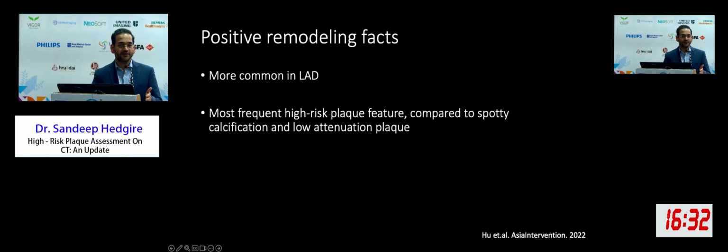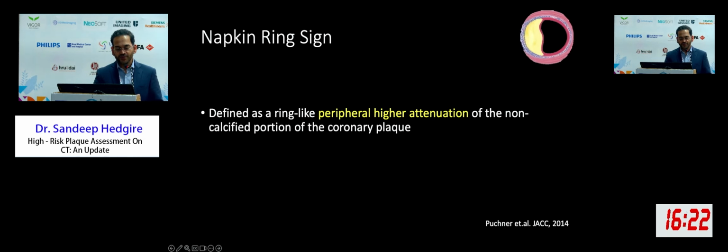So high-risk plaque feature like positive remodeling is much more common in LAD, and it is the most frequent high-risk plaque feature in comparison with other features that we are talking about today. Let's move on to the napkin ring sign.